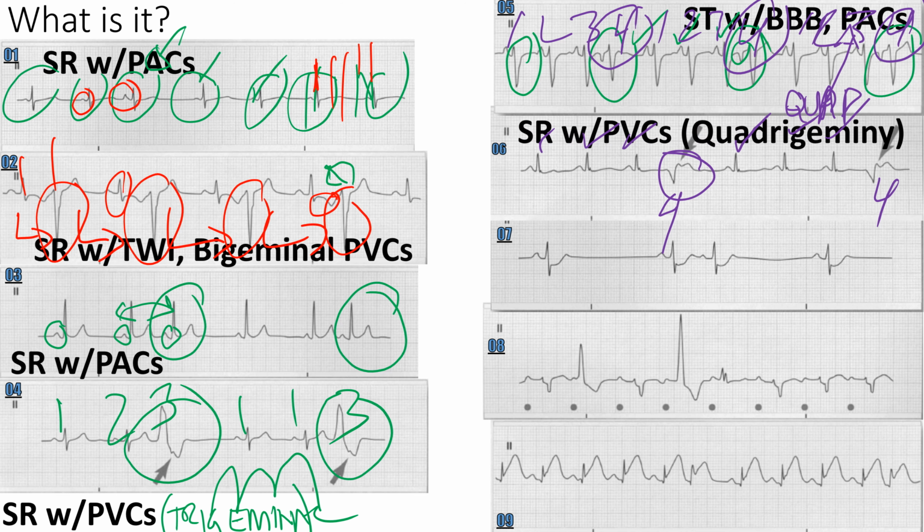Is that really sinus rhythm? Let's double check our work here. So we got, let's find one that lines up pretty nicely. This guy lines up. Got 300, 150, 100. It looks like it's almost sinus tach. Also, remember this is irregular, so we should be using our 10x method, where we got 1, 2, 3, 4, 5, 6, 7, 8 beats in that 6-second strip. So that's a heart rate of 80.